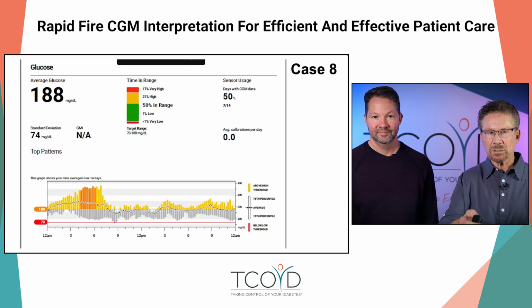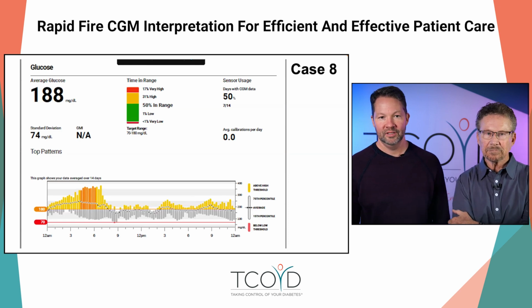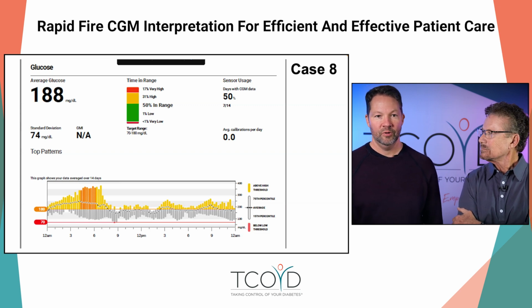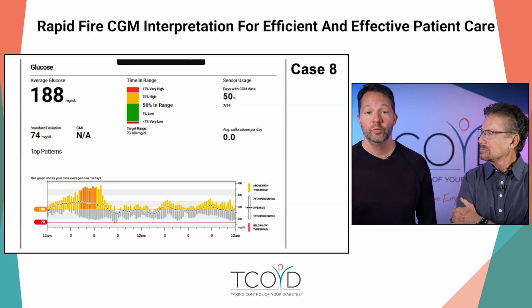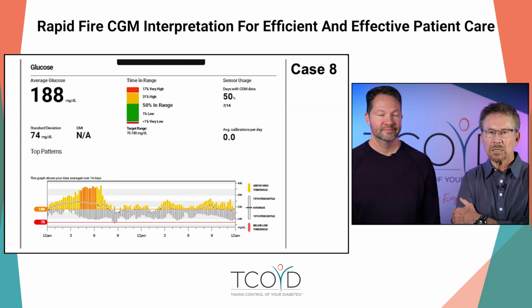Now we got to squeeze in this last case because it's the most fun. Okay, so to cut to the chase here, nighttime control is the problem. So either this person is just going crazy werewolf and eating pizza and all things at night, or this is some kind of nighttime worker. A bartender who works at a club, or a shift or Uber driver, somebody that's working at night and sleeping during the day.